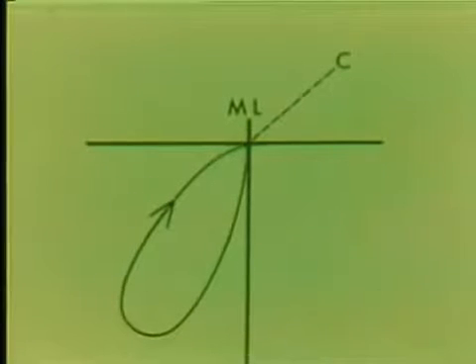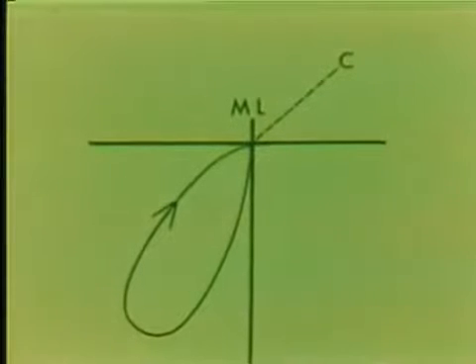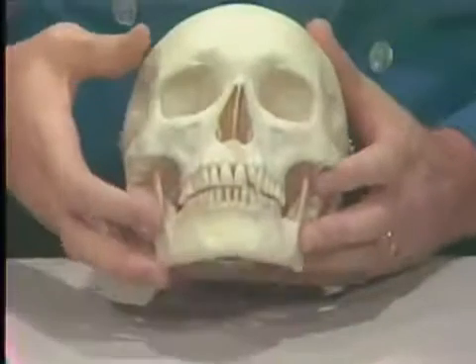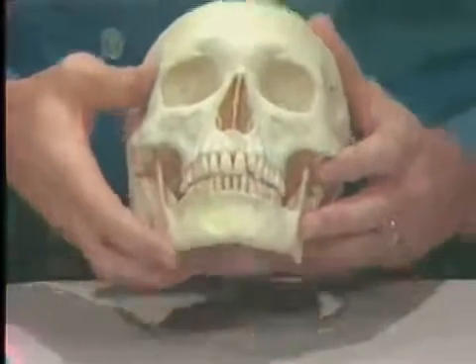So this is our pattern to show chewing, one that we demonstrated with wax to you on the patient before. Now we'd like to go back and discuss the working and balancing movements of the mandible.